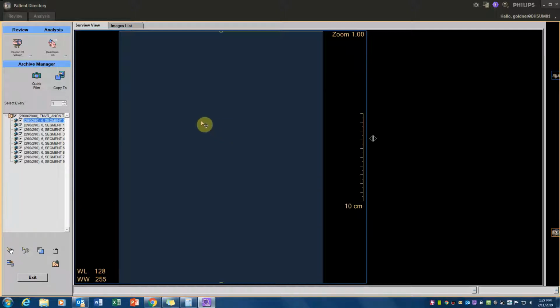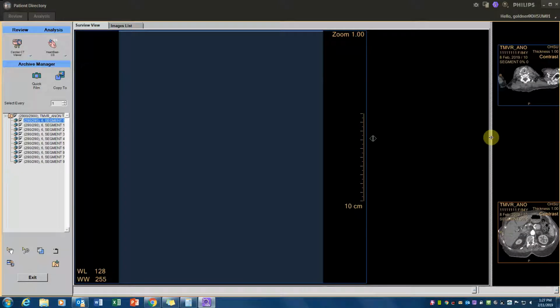Hello and welcome to this instructional video on how to measure the mitral annulus for transcatheter mitral valve surgery. So first thing, we're going to open our multiplanar reformat tool.